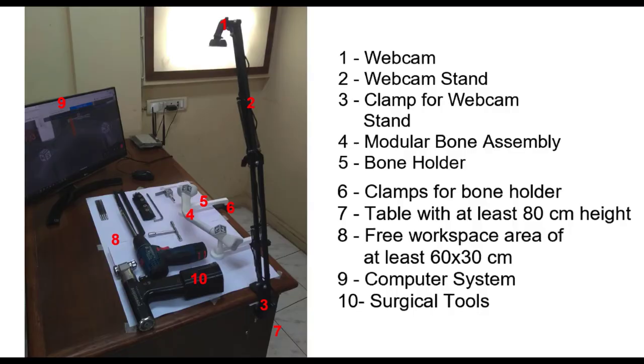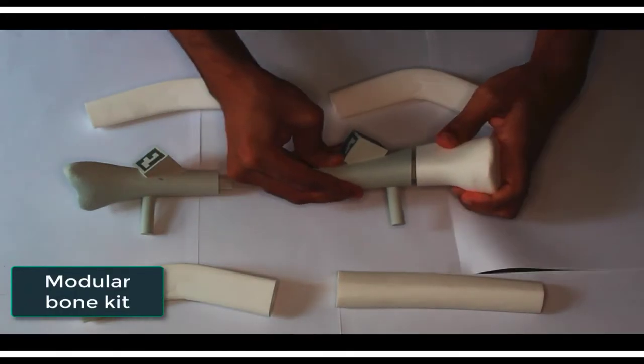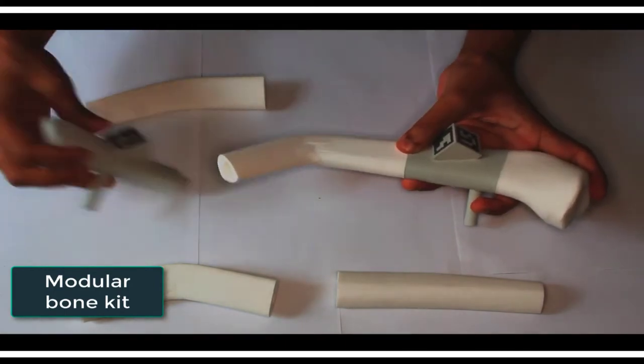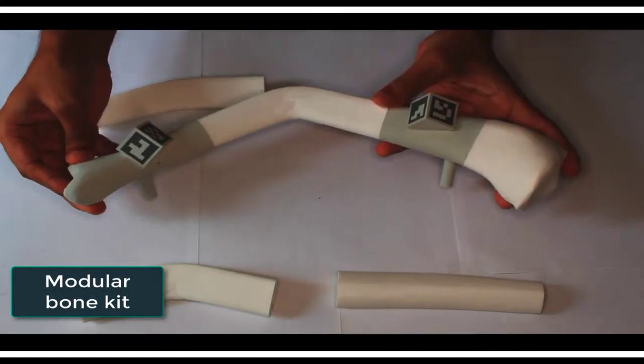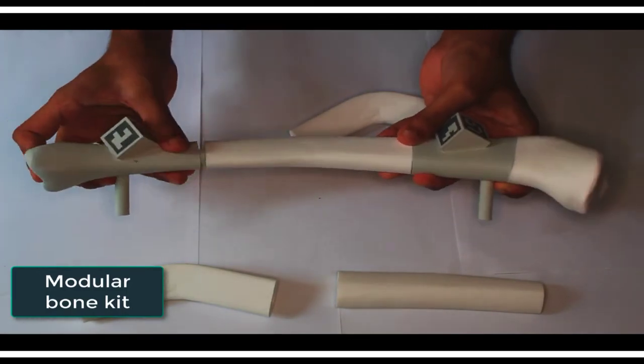For this, the trainee uses a web camera, a few clamps and fixtures to assemble a training setup as per the instructions. The trainee will also have basic tools for drilling and cutting the bone models as well as an external fixator implant. The bone models will be assembled using the parts from a modular bone kit. The parts of the kit can be assembled to form various types of deformed bones for different case studies.